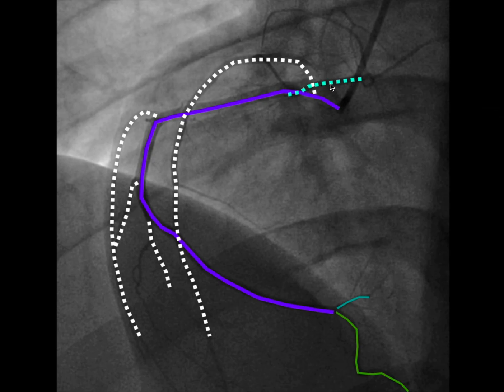This is that vessel we looked at in the prior angiogram that had contrast hang up. I think this is actually an atrial branch because you can see it seems to be going up here, not in the same direction as the RV marginal branches. Either way, I just wanted to point out how different it looked in the before. And notice that we actually didn't see this branch at all in the current day angiogram.